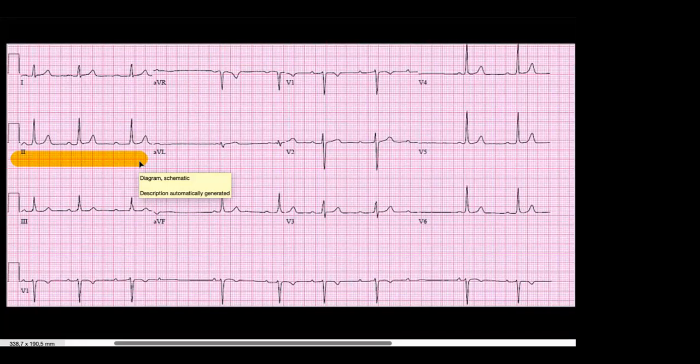So the AV block second degree type 1, or the Wenckebach, is very simple to spot on an ECG. You look at the P and the QRS complex, and look at the intervals between the P and the QRS complex. You will realize that the first one is maybe 220 milliseconds, the second one is 250 milliseconds, and the third one is maybe 300 milliseconds. And then abruptly, it stops, and the cycle resumes again. Based on that, it's not a sinus rhythm, but it's also not something that is clinically dangerous.